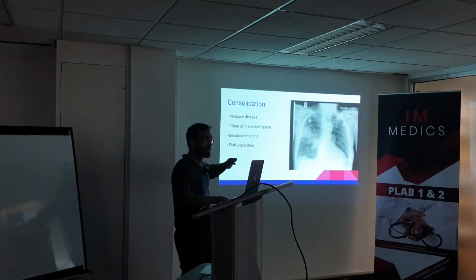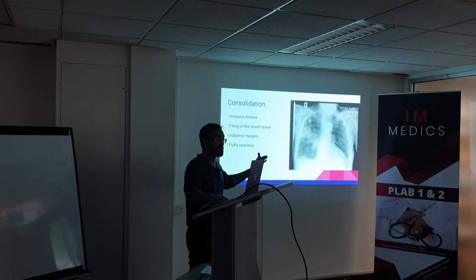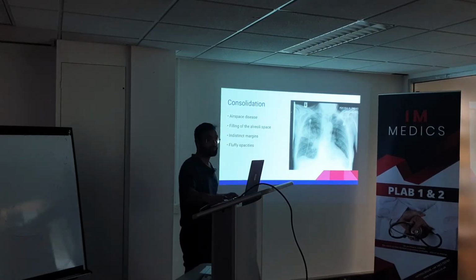Then you look at the clinical picture. If they have temperature, or if they have weight loss, you look at cancer. If they have coughing, then you look at infection.